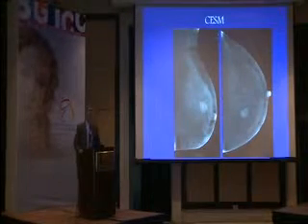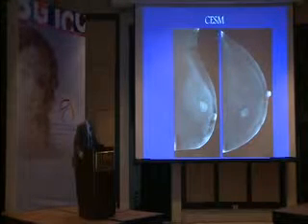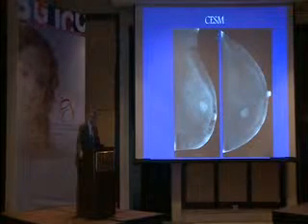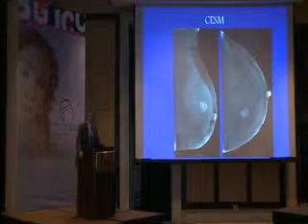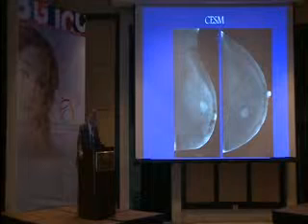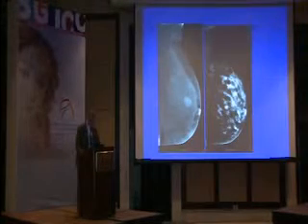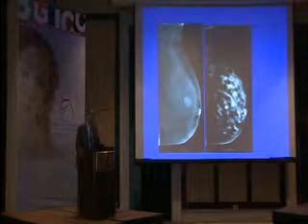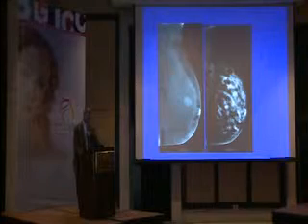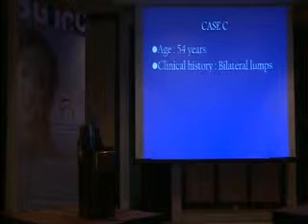So contrast enhanced mammography, of course, lots of presentations we heard this morning about the value and the usefulness and the sensitivity, etc., of the spectral mammography. And I don't want to go into more after what you heard. And this is the MLO of the same cancer. Okay, now we go to cases.